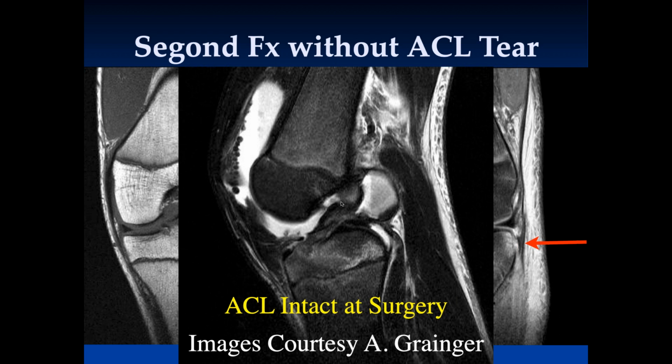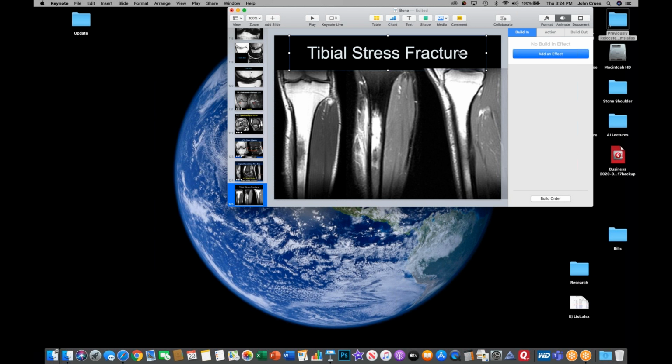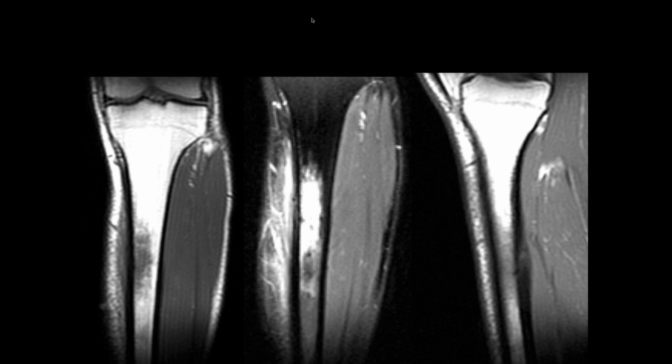But it sure doesn't look intact. Well, does it, John? No, I don't think I would have called it intact. I wonder if the surgeon was right. I don't know. Okay, so what do you think of this case?